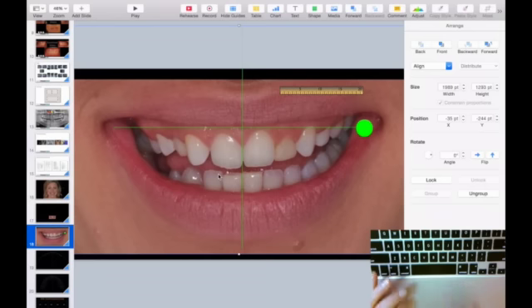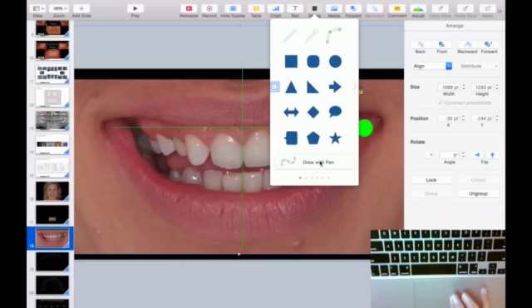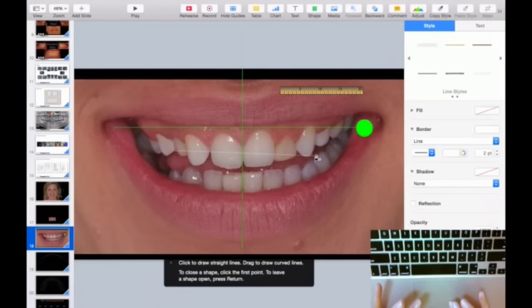And to work on my DSD, I have to bring my intraoral picture. So I define very easy to see points. Whichever first catches my eye are the ones I choose, okay? There's no exact science for this. You have to choose the ones you see best and clearer, okay? So I'm gonna say I see this junction here and this one. They catch my eye first. Double click the end of the line so it stops.